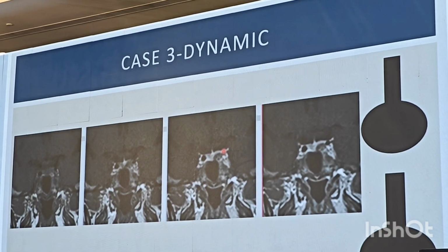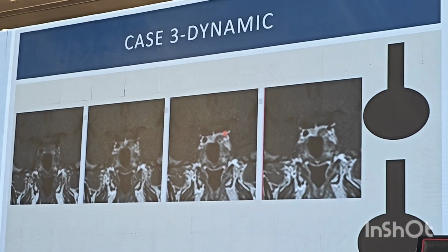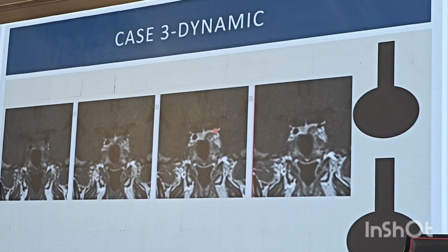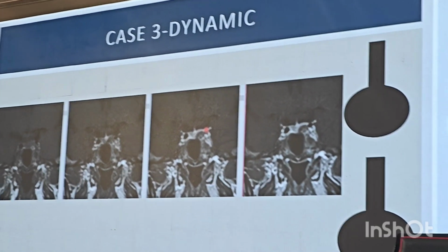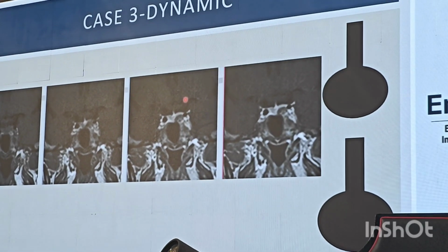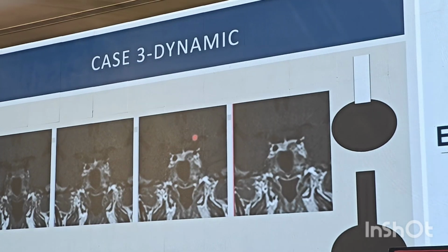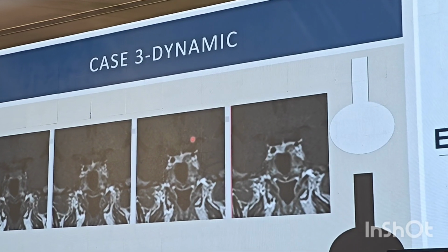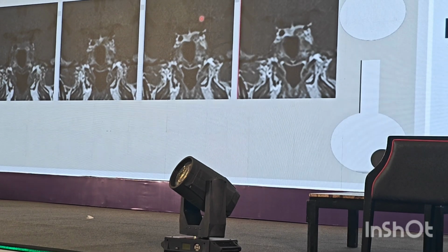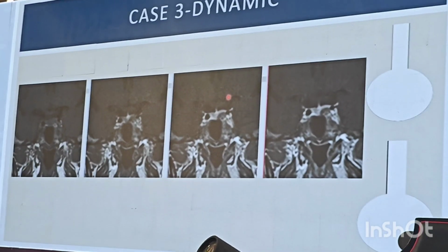When you take your plates, the imaging films which are given, each line corresponds to one time period. So 30 seconds, 60 seconds. When you see this in the 60 or 90 seconds, there is a small defect which is not enhancing. Just like this, the gland through the infundibulum, the whole gland should enhance. This case is something like this. There is a small area which is not enhancing at the same time as the rest of the pituitary.